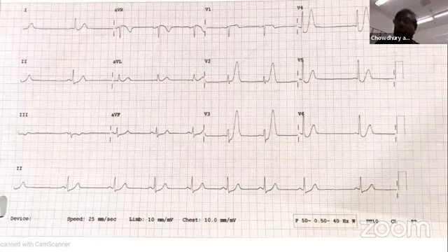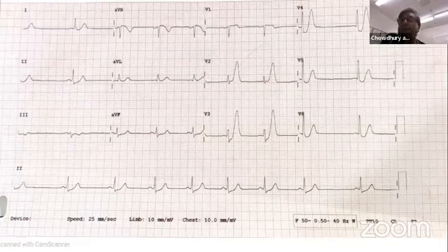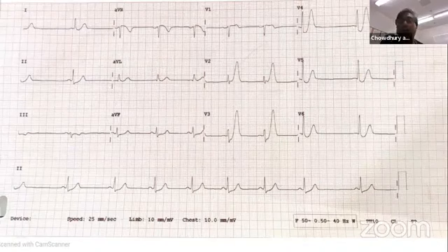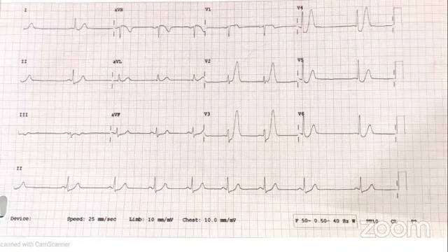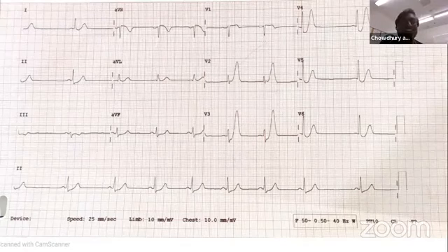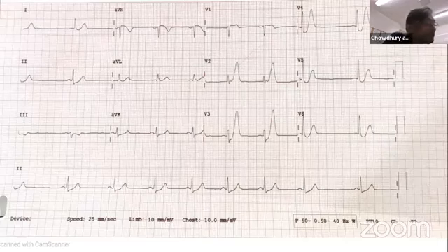If there is an ECG like this and I don't know anything about it, then I will think of a few things: hyperkalemia, maybe hyperacute T, maybe De Winter, with the classical LAD. That's the classical thing. So this is beautiful.